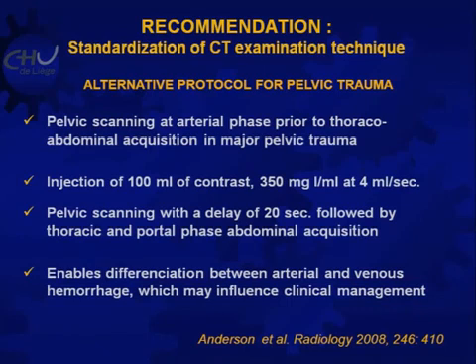There is an alternative protocol for pelvic trauma which has been described, and it might be interesting in some patients where your attention is immediately attracted to the pelvis, and there is almost 100% certainty that the patient is bleeding from the pelvis. Here you can start with the pelvis.